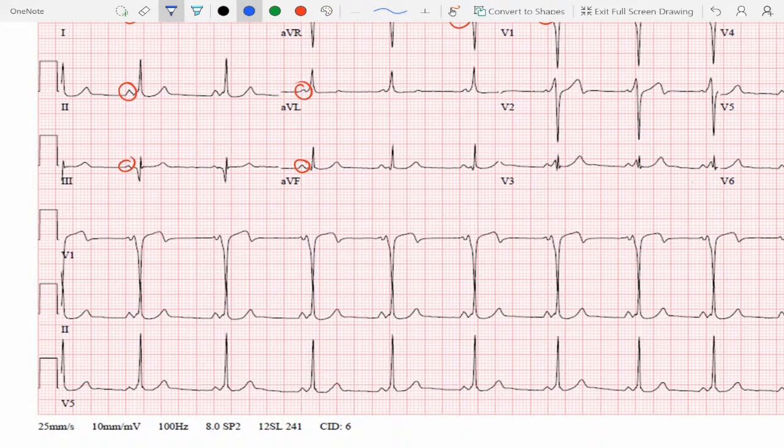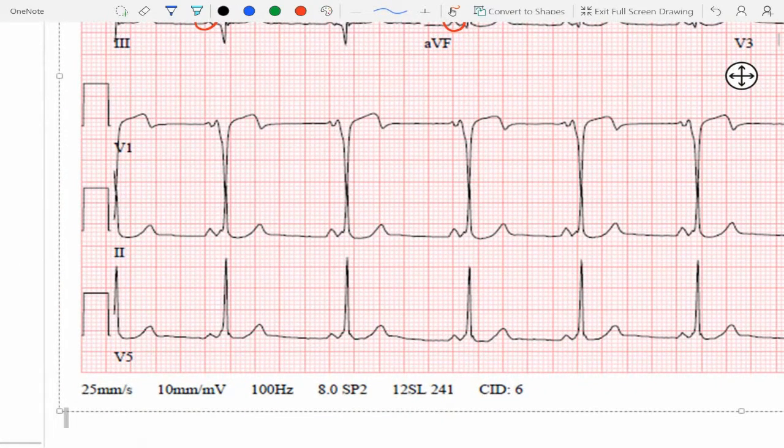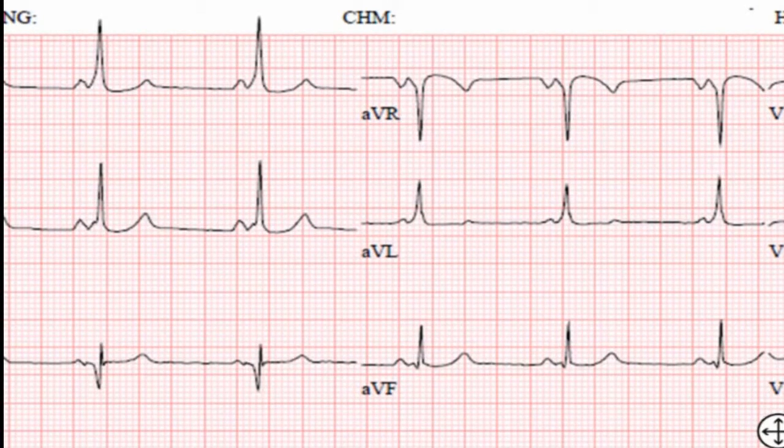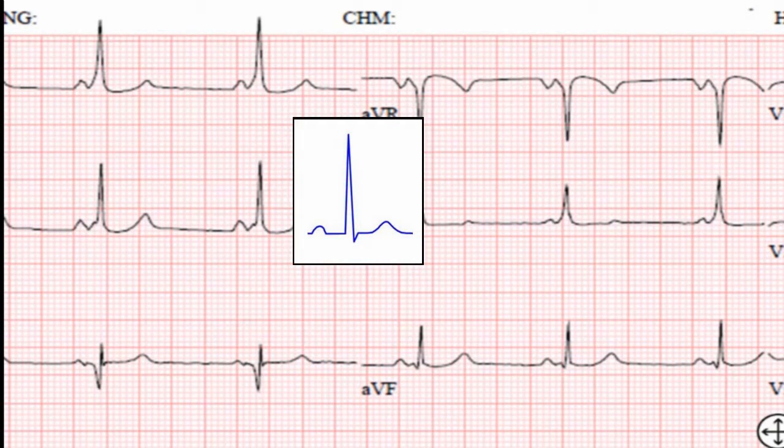And right off the bat, then you look for QRS, and then you look at the morphology of the QRS, and then the QT and the T waves. So here, if you look at the morphology of the QRS, it doesn't look completely normal. And then you see that the PR interval is somewhat shorter, eyeballing it, and you can actually measure it, and it'll be shorter. Because you conduct from the sinus node throughout the atrium, and then you go through the AV node and then into the ventricle through the His-Purkinje system. So you expect a nice separation between the P wave and the QRS, because the AV node does not produce any waveform on the ECG. It's pretty silent, and it takes a while to conduct to the ventricle.